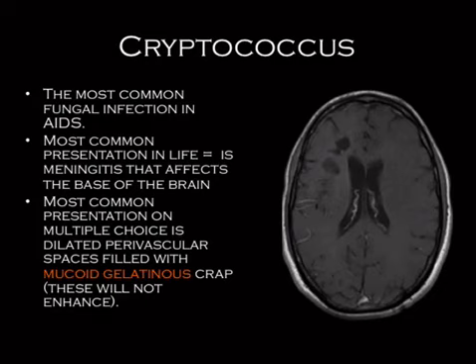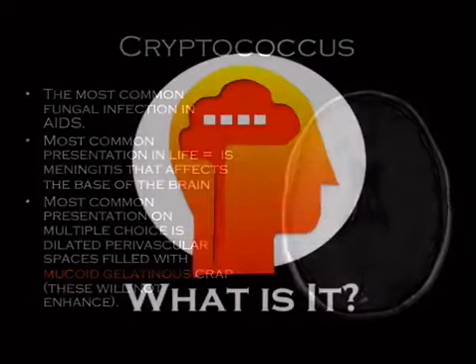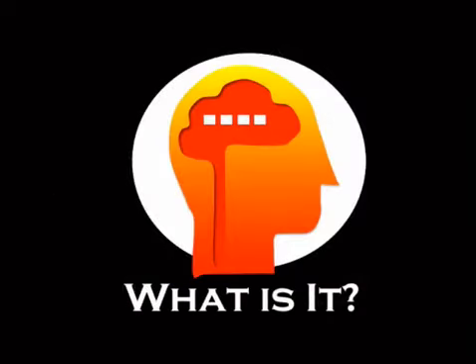leptomeningeal enhancement that has a basilar predominance can be a whole bunch of different things. But most common fungal infection in AIDS, gelatinous pseudocysts. That's what you need to remember for crypto.